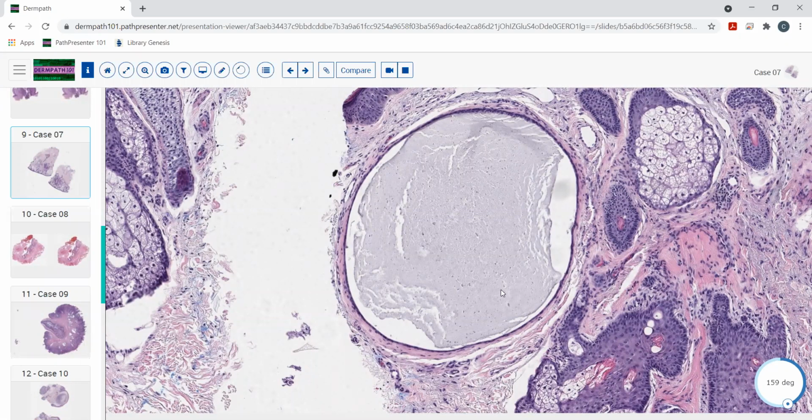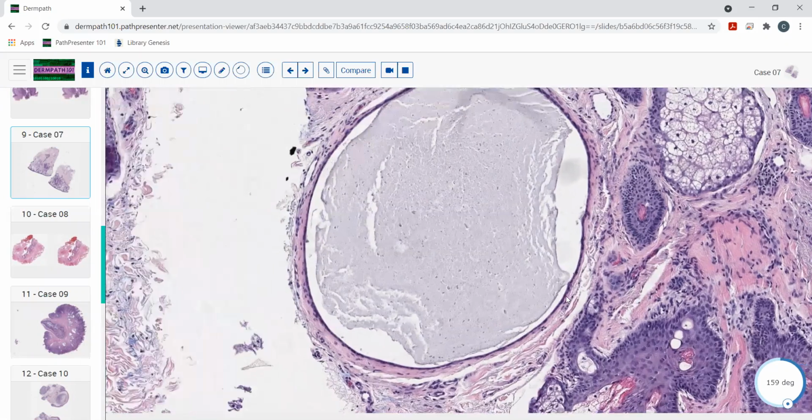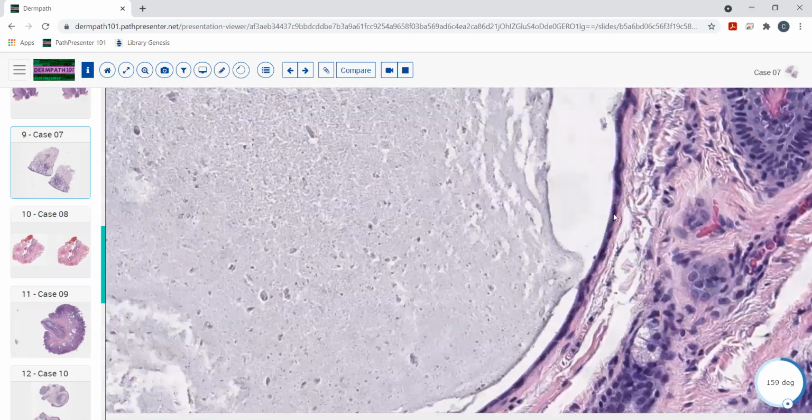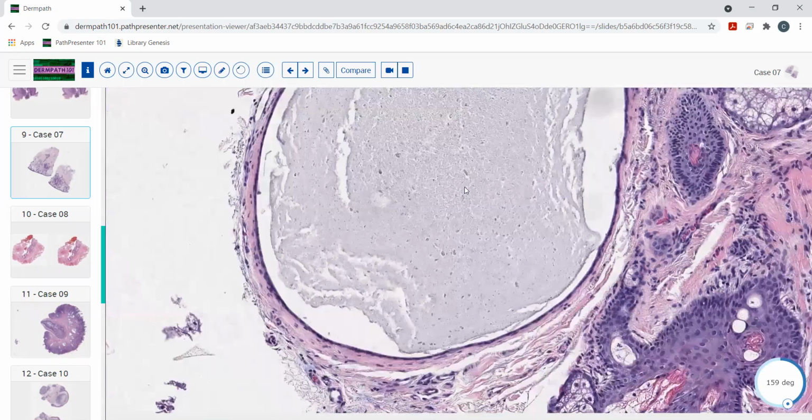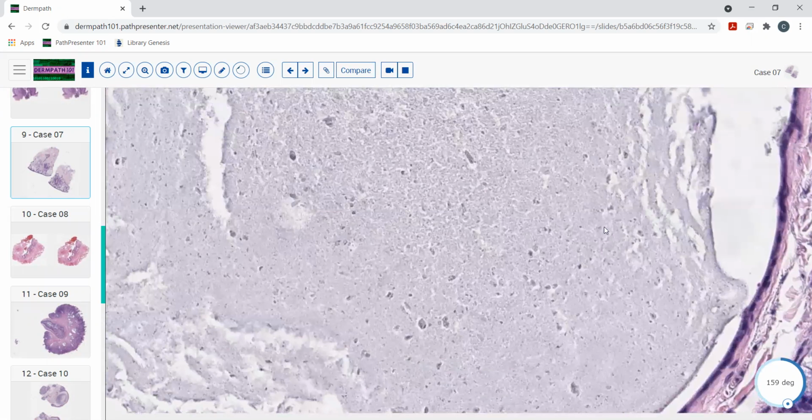For some reason, it gets plugged up, it forms a cyst, and then you look at it in high magnification, you see it's lined by one or two layers of cuboidal epithelium, a very small, thin layer, with amorphous material in the center of it. It's kind of grayish, granular, and this is basically eccrine sweat. So this is an eccrine hydrocystoma.